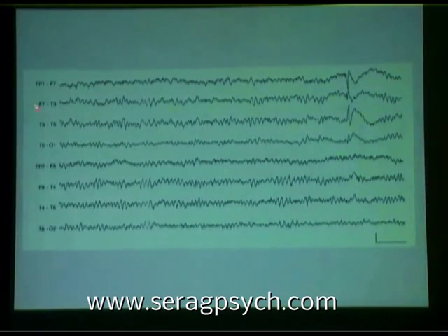See, there's more slow waves here on the left side at F7-T3 than there is on the right side at F8-T4. Right? Everybody see that? And that's sometimes the only thing you're going to see on outpatient EEGs. You won't always see the nice spike. Again, notice how often anterior temporal spikes tend to cancel at F7-T3, they both being involved there.